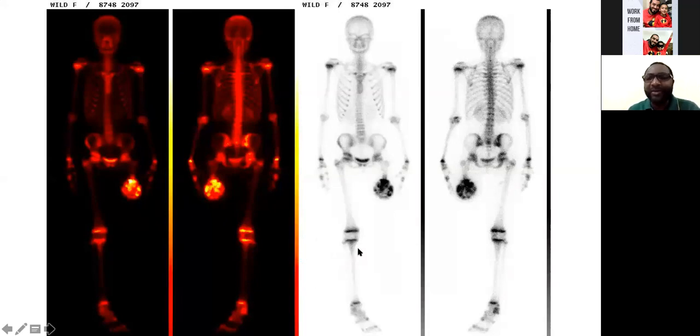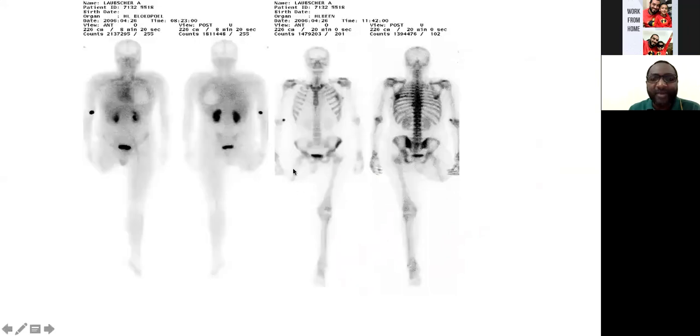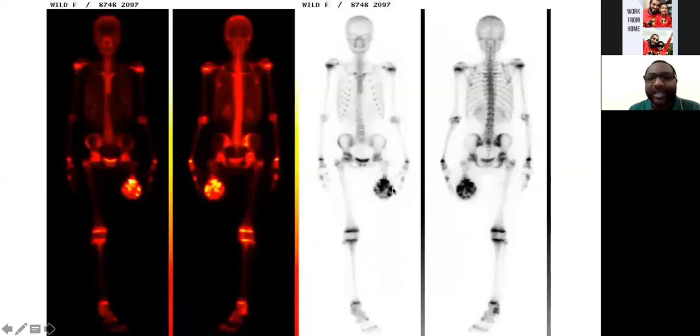Now, another example of a 19-year-old young man who has osteogenic sarcoma and had an above knee amputation has been followed up. This is 5 years after his amputation. He was sent for a bone scan because there was a worry of a recurrence at the site of the stump. Compared to the previous patient who didn't have any abnormal uptake at the site of surgery, you can see in this patient that there is an increase in uptake, which is irregular. So this represents an area of recurrence.